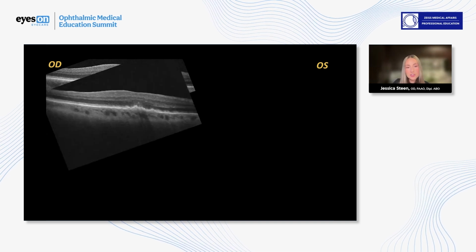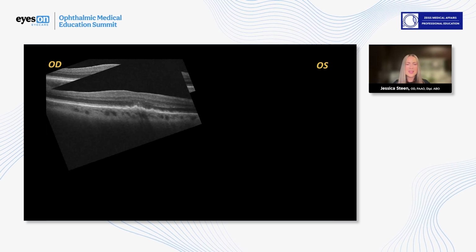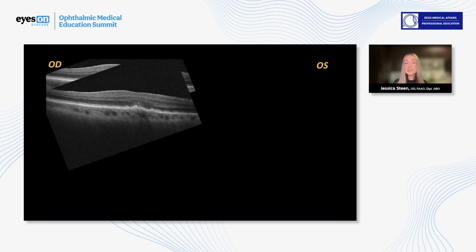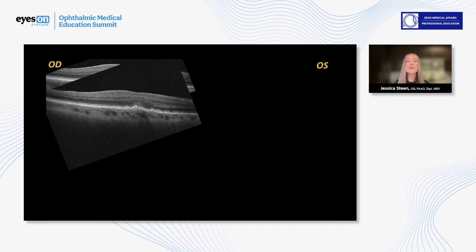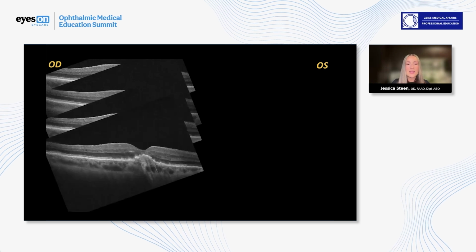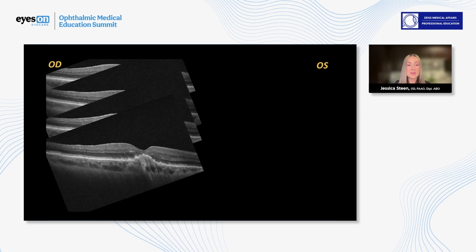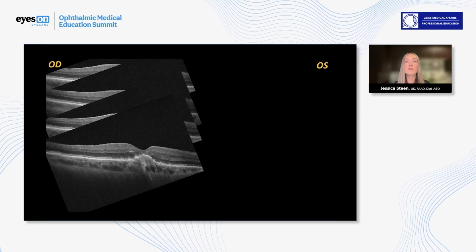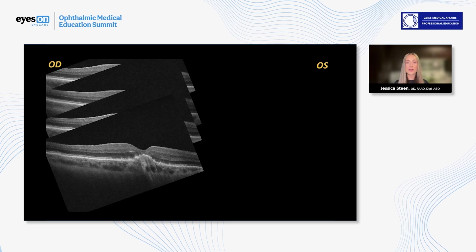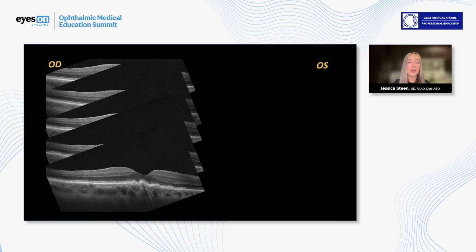Moving inferiorly, just towards the center of the fovea, we see our first hyperreflective foci, the combination of anteriorly migrated RPE cells with potentially activated microglia, another important risk factor for progression to late-stage disease. Now we see this turbid, irregular drusenoid pigment epithelial detachment, once again with overlying RPE change and increased signal extending into the choroid, reminding us of that damaged RPE, ellipsoid zone, and outer retina.